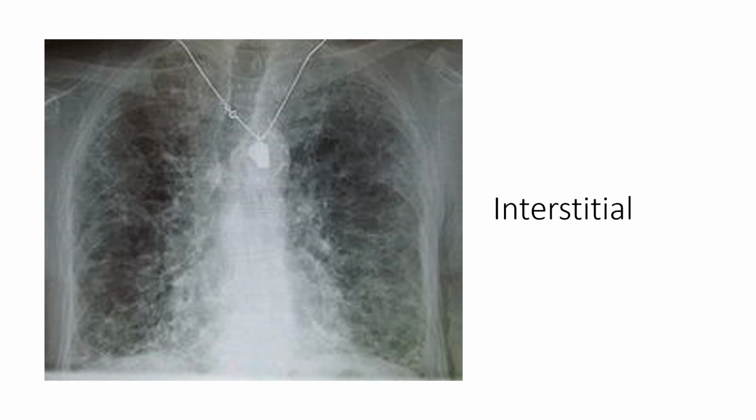So A, B, C, D, E, F, G, H, hilar was the last one we went, and then I is the last one that we'll go over here, and this is the interstitial space. So interstitial spaces, those tiny little air spaces, and so usually you won't notice this unless they have something significant going on. This is a better picture of an interstitial lung.